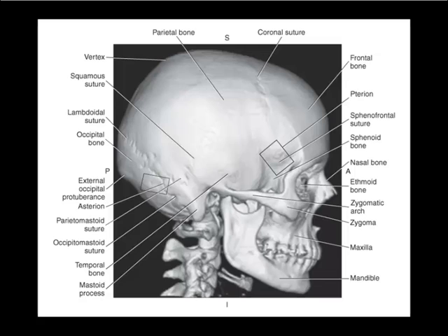Let's take a few minutes and look at some more sectional and 3D images of structures that we've already introduced earlier in this module, just to reinforce some of the concepts that we have learned. This is a 3-dimensional CT image reconstruction of a lateral skull. The cranial bones and sutures are really well demonstrated in this one, and the image is wonderfully labeled.